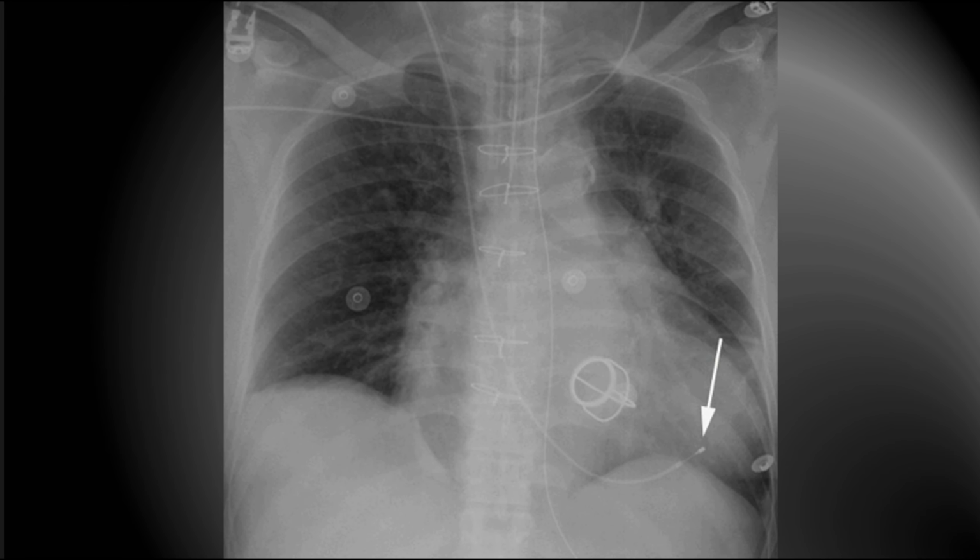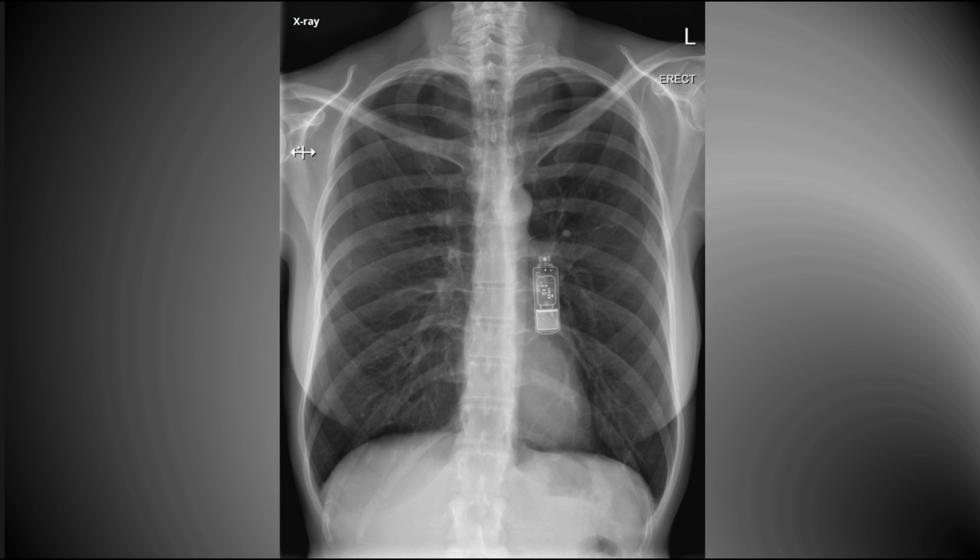Notice that there are three things here. The patient is clearly post-op cardiac surgery. There is an endotracheal tube. There's mitral valve replacement. And what do you think this is? It's a pacing wire. And these are commonly placed post-op for cardiac surgery. What about this picture? This is a loop recorder.